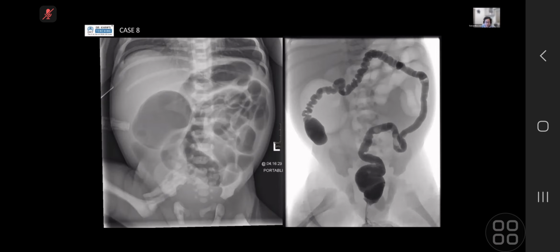Yeah, so you're right. This is one of ileal atresia, and it's often very hard to tell whether this is an ileal atresia or a meconium ileus, because the main difference is that in one you can see the meconium plug, the meconium in the terminal ileum, and in the other you cannot. But as I said, it really depends on whether you can reflux contrast back into the terminal ileum. If you've got a competent ileocecal valve, then it can be very difficult. Often you can only make this distinction when the surgeons have gone in surgically. So this is one of ileal atresia, and you can see this diffuse microcolon of the whole colon, which is a lot smaller in caliber than the width of the vertebral body. Okay.